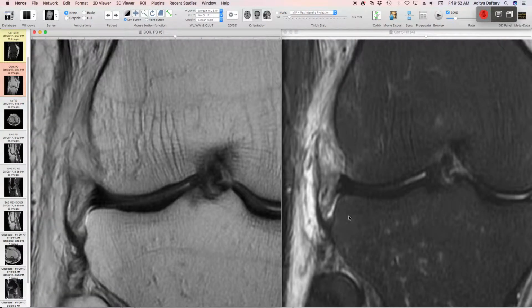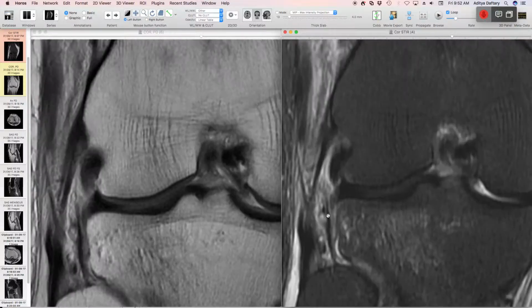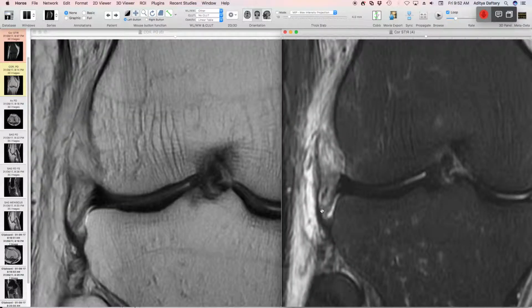You can see the slender band here that extends towards the lateral meniscal attachment, and then here you can see the more proximal attachment, which should be at the femur, which sort of is just hanging out in space and waving around. We also see a lot of soft tissue edema in this region, which would confirm that somebody has sustained an anterolateral ligament injury at its femoral attachment.